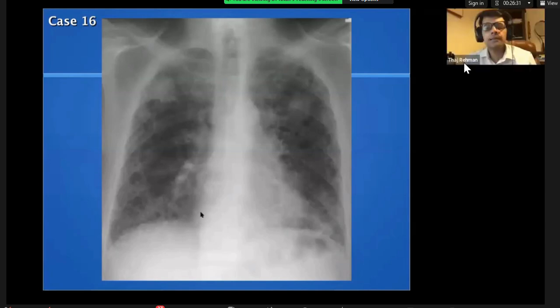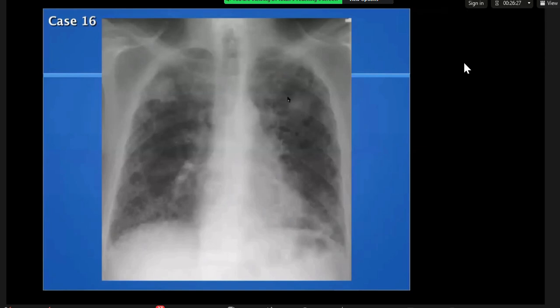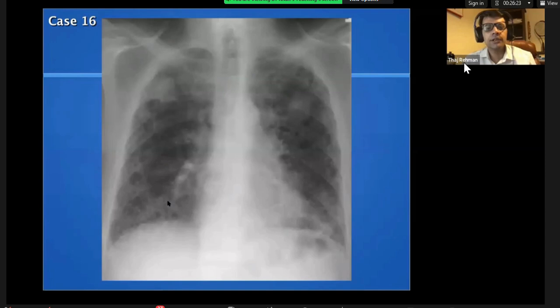That's a reasonable diagnosis, but there are reticulations in the bases. And there are nodules. Nodules up, okay. So these are actually rheumatoid nodules on a background of reticulations, interstitial fibrosis. Look for other clues, which are unfortunately not there in this X-ray, like clavicular erosion, etc. But keep rheumatoid nodules in mind when you see interstitial fibrosis.